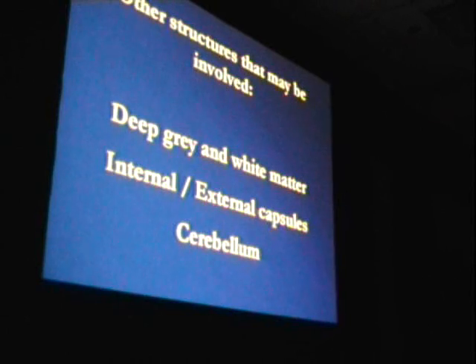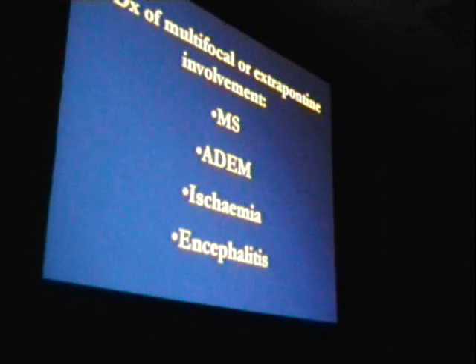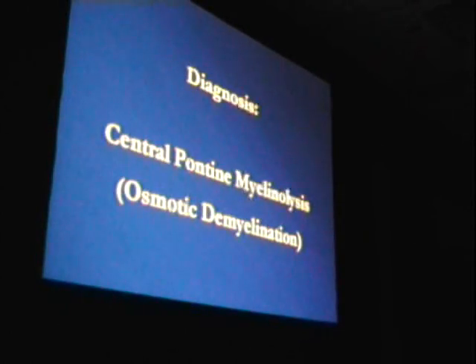Brainstem gliomas tend to expand the pons far more markedly and wrap themselves around the basilar artery, while significant small vessel ischemic change tends to be a little bit more diffuse and may not spare the periphery to the same extent. If you see it outside the pons in any of these other areas, the differential diagnosis is greater and would include acute disseminated encephalomyelitis, tumefactive MS, extensive ischemia, or depending on where exactly, it may mimic an encephalitis as well. So this is just CPM demyelination.